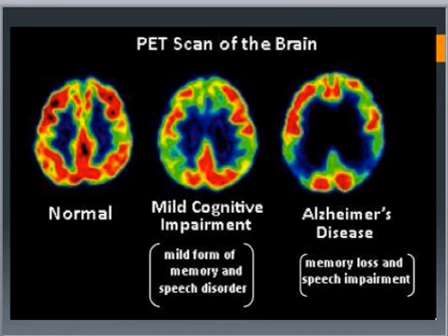That's really what's amazing about the PET scans, to be able to visually see the function, the activity in the brain, and what's going on, so we can see if there's a reason for the patient's speech impairments or memory loss.